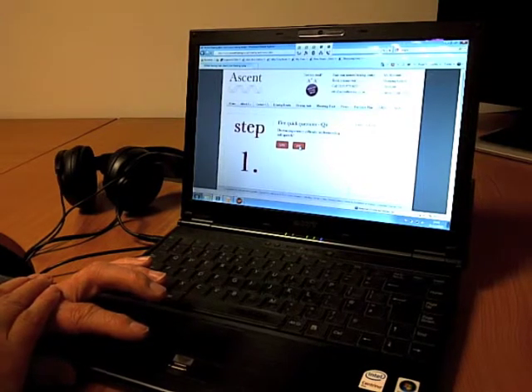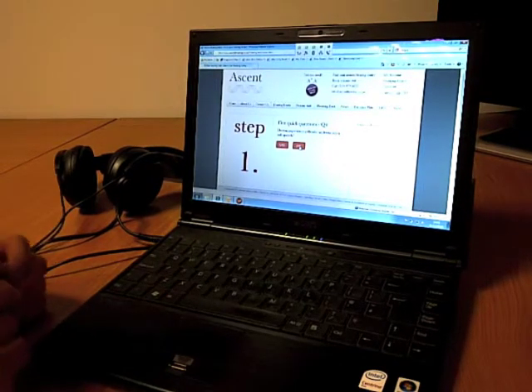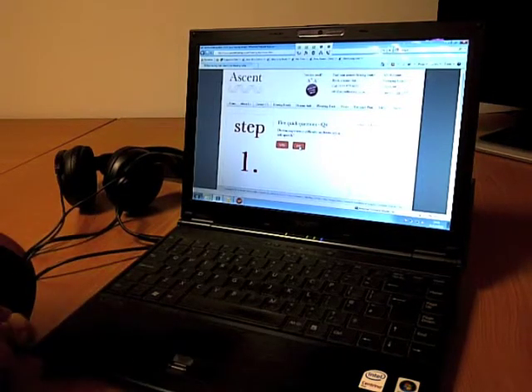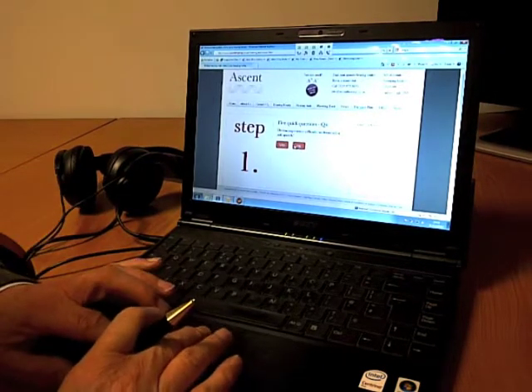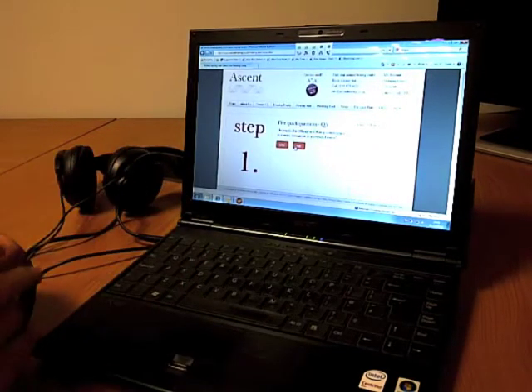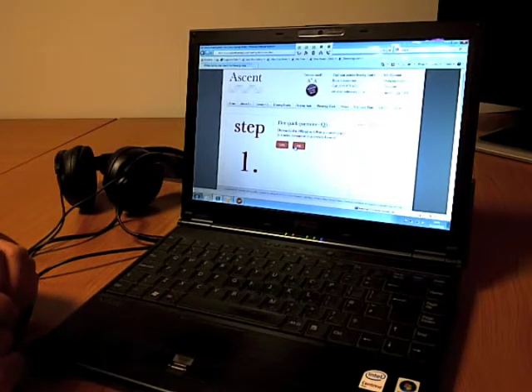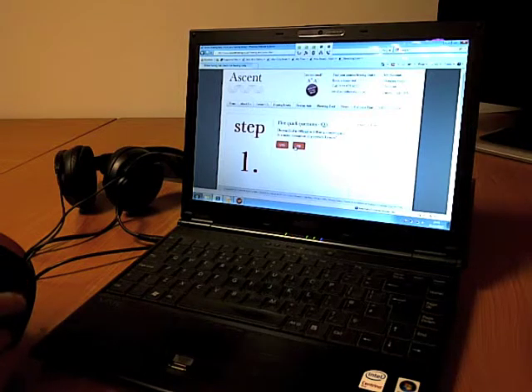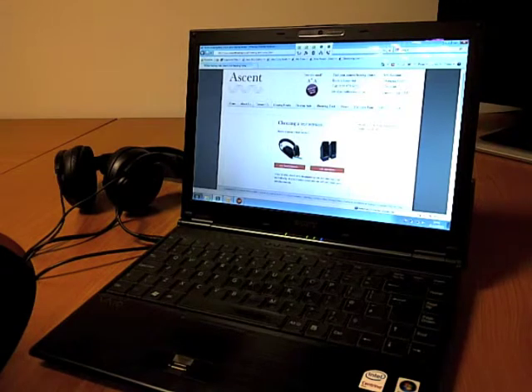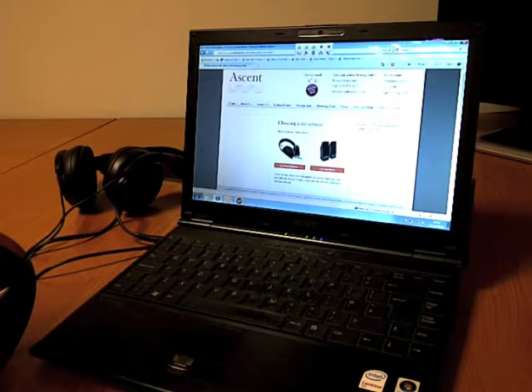The fourth question is, do I sometimes experience difficulty understanding soft speech, maybe female voices or young children? So again, simple, click yes or no. So I'm going to click no on that one. And the final question, and as you can see, I've only been going about 30 seconds. Do I sometimes find it difficult to follow a conversation, particularly if it's a noisy environment, a group of people, a restaurant, crowded room? So again, I do actually sometimes have a problem there, so I'm going to click yes. That's the end of the questionnaire, and then you move on to the second bit.